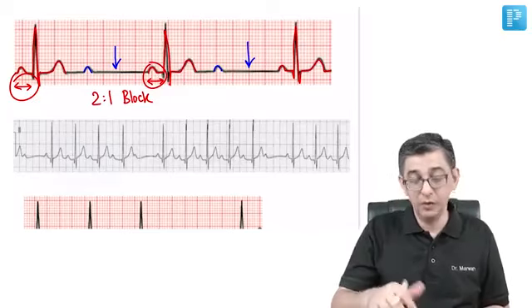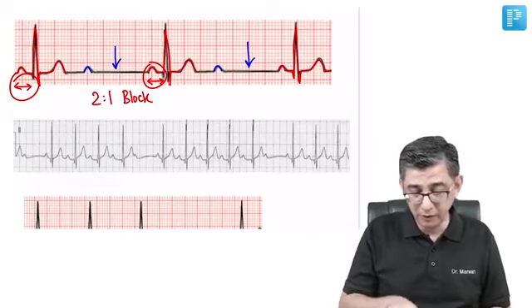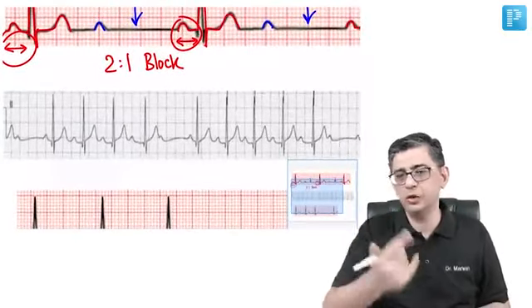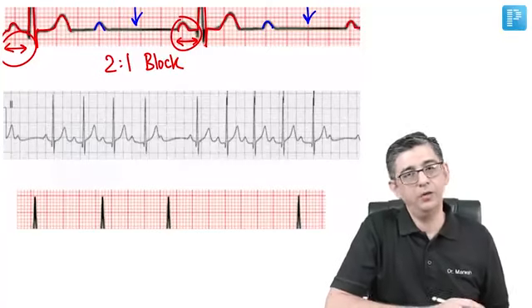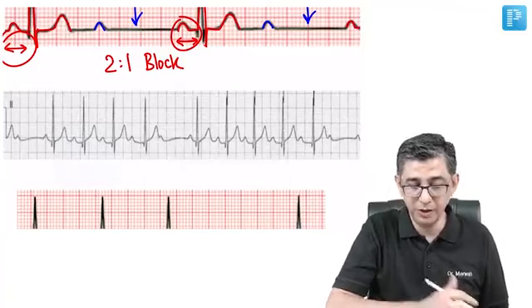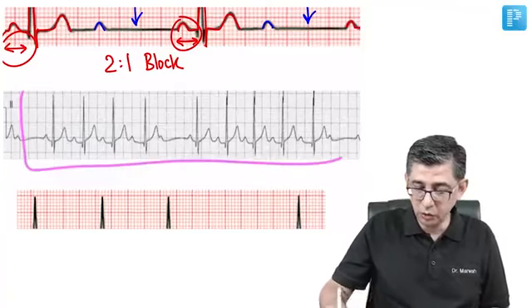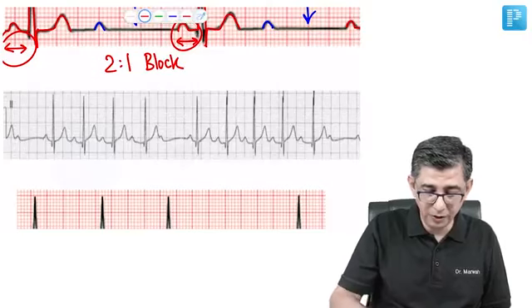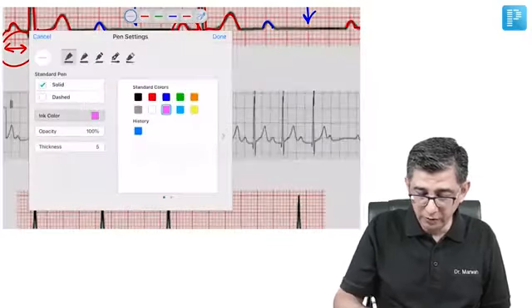And once we have done this, which is important from the exam perspective, let's do this activity to simulate the exam scenario. Let me say I give you 1 minute to evaluate what is going on in the ECG which is currently shown on the board. So let's do a bit of mathematics and a bit of tracing here, so that we are able to orient ourselves better.